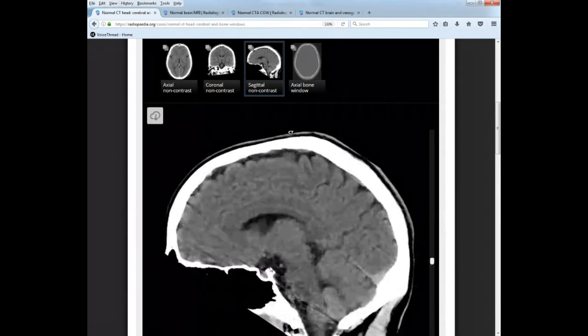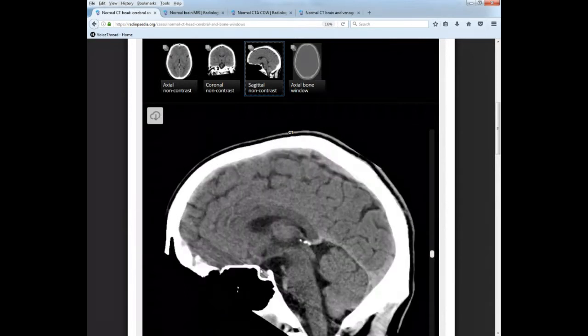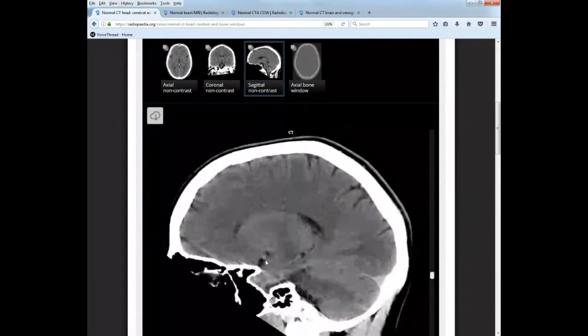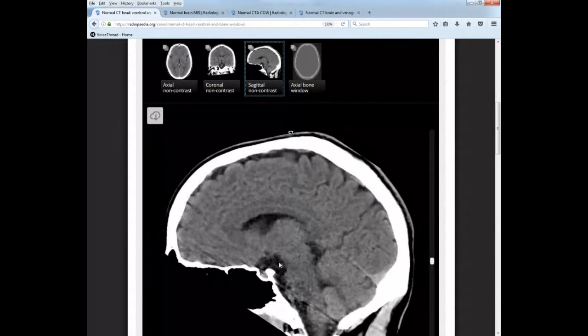And the optic chiasma is in here, okay? You can kind of see, this is really crappy CT, but here's kind of the optic chiasma in here, where the optic nerves come up and then they cross over. Okay, so we've covered ventricles, we've covered cisterns. Also located within here, within the suprasellar cistern, is the circle of Willis, which we'll go over when we talk about the arterial system.